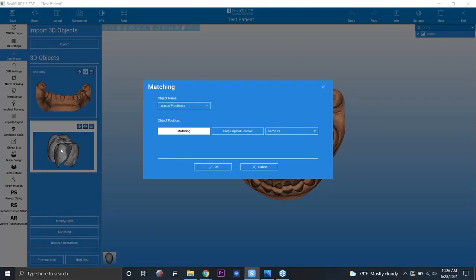However, you can see that this is actually a virtual wax up. This was an intraoral scan, and then the technician, whoever created this wax up, actually digitally designed it right off of that intraoral scan. So what's really nice about those virtual wax ups is their relation to the model is retained even upon export. So what I can do is I can say, now that we moved the original STL file into a new position, go ahead and move into that new position as well in relation to your original spatial relation to that STL.